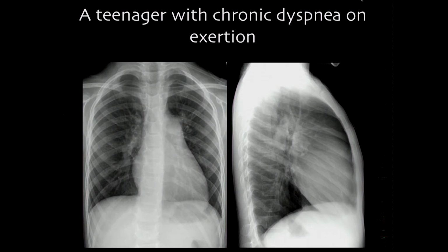You have here the trachea coming down. This is a right upper lobar bronchus. This is left upper lobar bronchus. What is that? Right pulmonary artery, left pulmonary artery. Both are big, making a big potato, and then giving rise to small sprouts. Okay? So central peripheral discrepancy is well shown here, and that is very, very characteristic of pulmonary arterial hypertension.